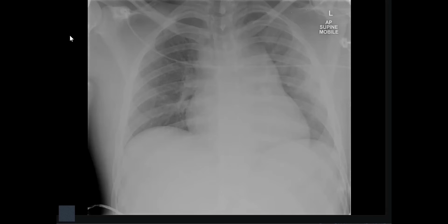Suspecting bilateral apical pneumothorax. However, it appears to be small in size. I am not able to see the visceral edge clearly to make it confirmatory, so not definitive. In such a situation, a lateral shoot-through or lateral decubitus view may help in the diagnosis.